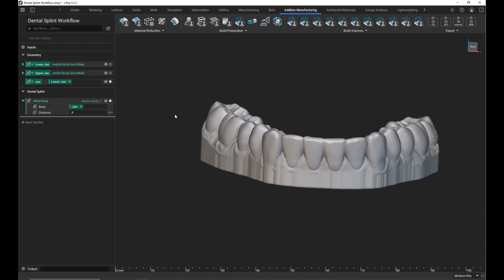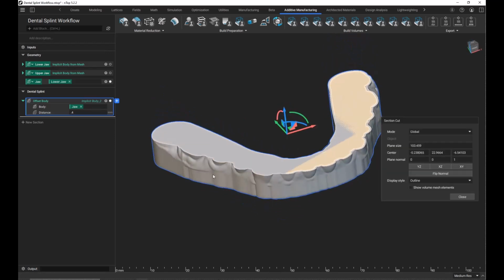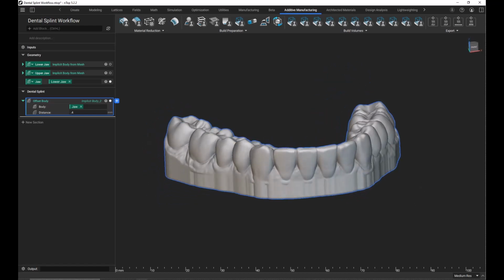It's just completely encasing it. And as opposed to a shell, which is another method that I could have used as well, there's no opening in here either. It's a solid, so it's just an offset. So we have to do a couple more things than just that.